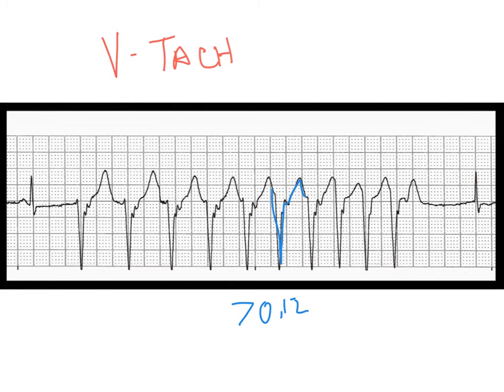Our rate, even though it varies, we have it right at 100, just over 100, getting close to 150, right at 150, even faster at 150, on and on and on. We have a real issue here. So this could be a lot of things going on.